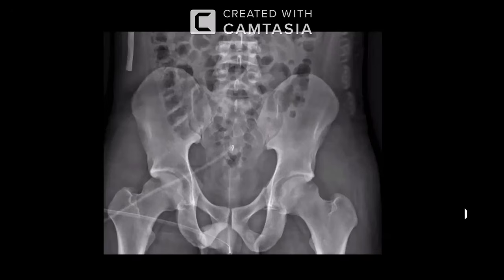Both sacroiliac joints appear normal. I'm following the iliac bones. They appear normal, and the symphysis pubis, as well as the superior and inferior pubic rami. I'm following the iliopectineal and the ischiopectineal lines. Then I'm following the femurs. The lesser trochanter and the greater trochanter are preserved, but I'm suspecting some discontinuity. I don't know if it is projectional. I can see there is a line as well.